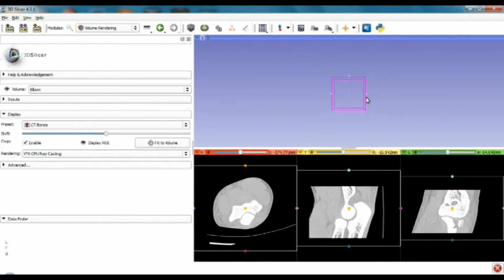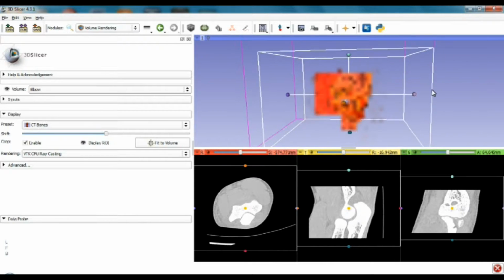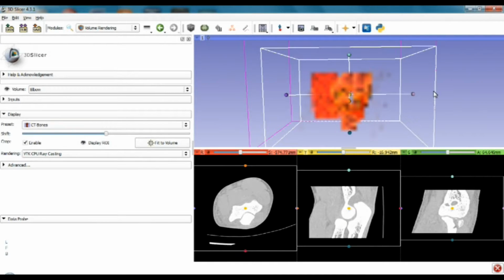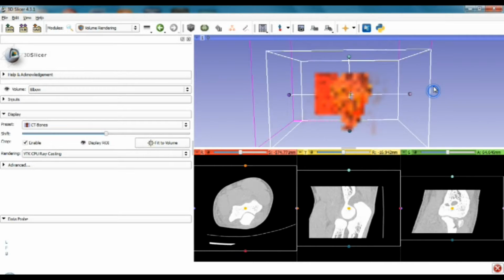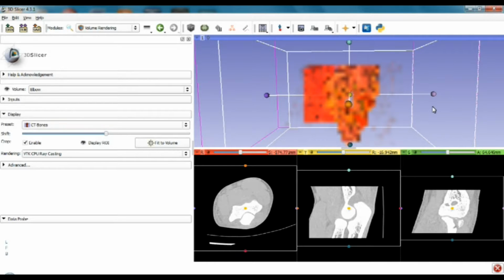The 3D rendering is often not visible till you zoom right out and suddenly you find it away from the center of the focus, and then click on it and recenter to bring it into the purple box. In the window with the volume, right click allows you to zoom in and out, and left click allows you to tumble the volume.